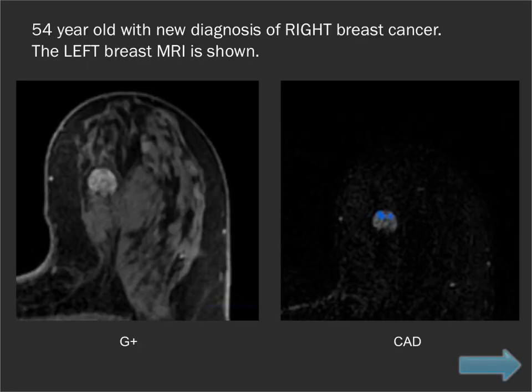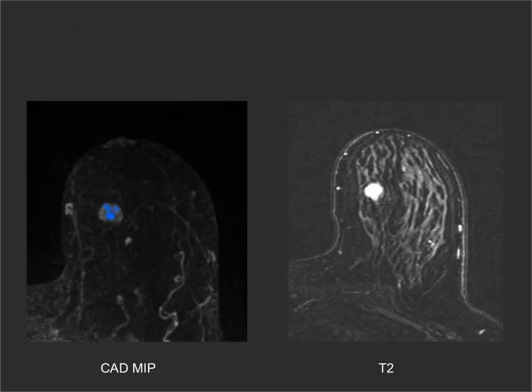This lady was undergoing a staging MRI for a right-sided breast cancer, and we saw this left-sided breast mass. We could not see it on mammography. Now, when you look at it closely, you can see it's lobulated. It's got pretty low-grade progressive type enhancement, but I think you can talk yourself into there being some dark septae within that mass.